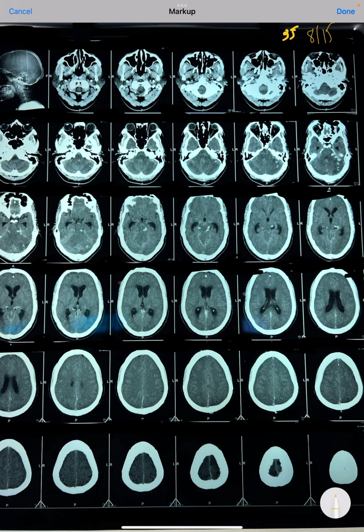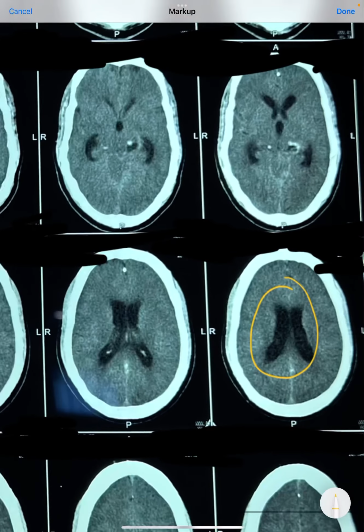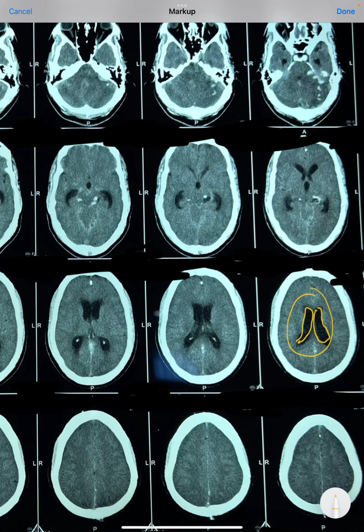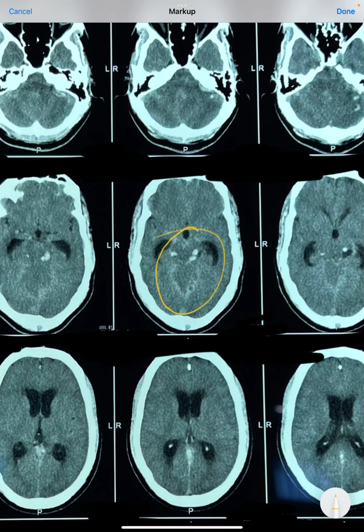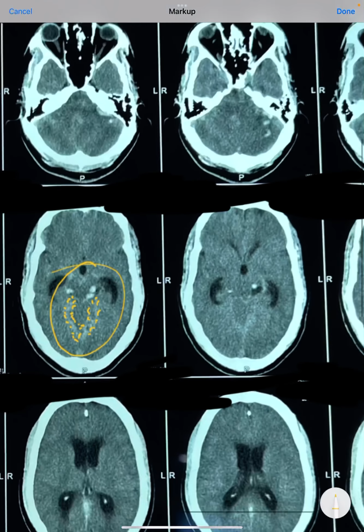Now, we see that the ventricles do appear much enlarged, both the first and second ventricles. For the age of 32, they look much enlarged. The second thing we can see is much hyperdensity, or dense white appearance, of the subarachnoid space. This is a typical area of the subarachnoid space where we should be able to find the sulci and gyri, but here the sulci and gyri are not at all apparent because of the cerebral edema and the presence of this dense white subarachnoid hemorrhage.